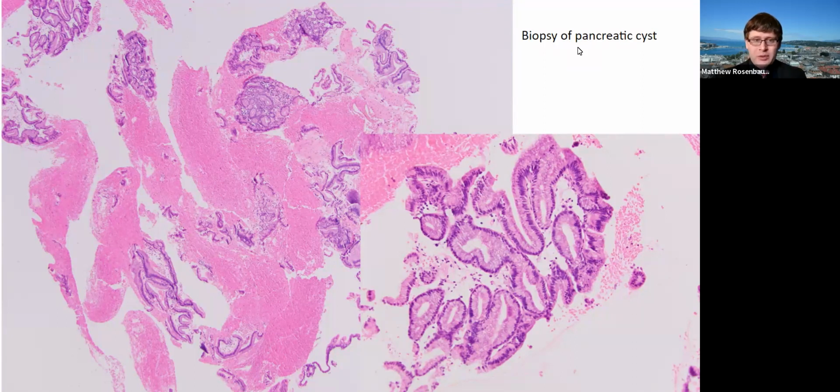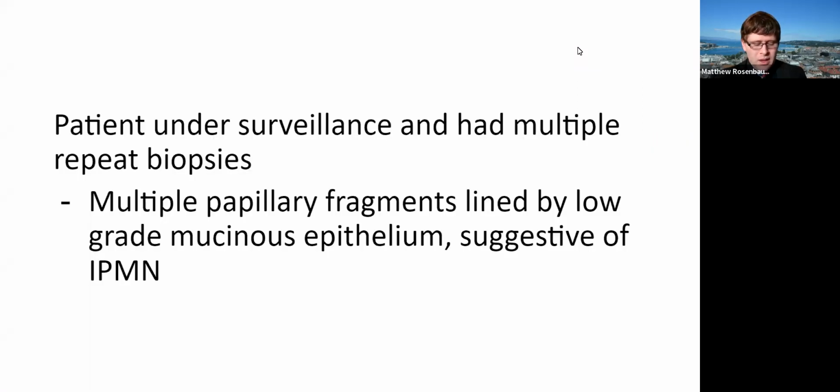So in this case, we're very sure that what we're dealing with is biopsies from the cyst in general. So basically this is low-grade gastric epithelium. This was repeated multiple times. They weren't fine just doing it once because this is a very concerning radiologic finding, but this suggests a low-grade IPMN, at least in what they have here. Of course, sampling bias is always a possibility.